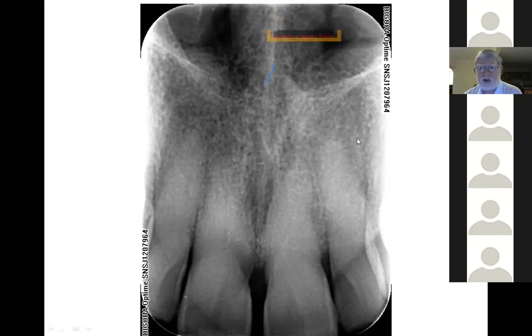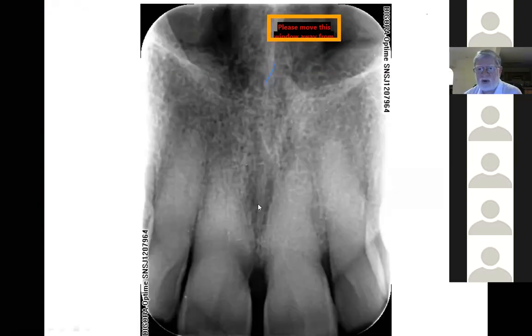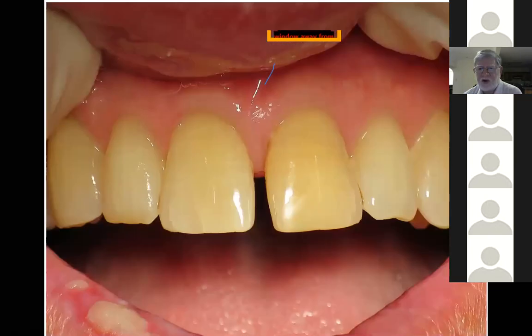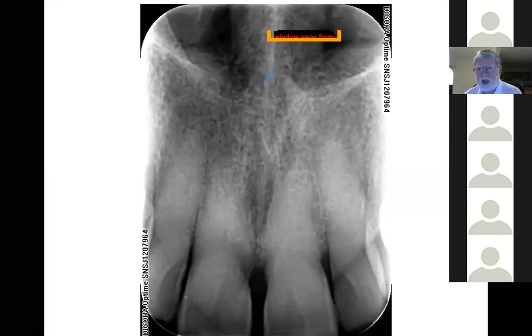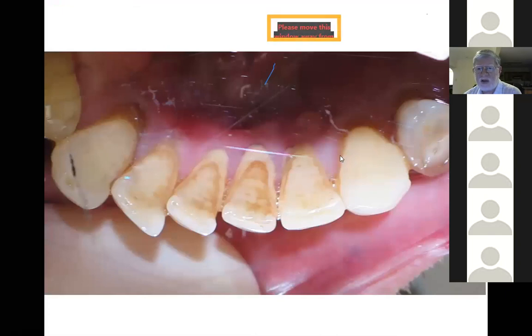And fortunately, you know, everything's all fine. We would maybe want to, if he wanted, perhaps whiten those teeth for him. If he's not concerned, leave those completely alone. If he's got aesthetic concerns, of course, there's options, but if he's got no concerns, this was an incidental finding, then all fine.